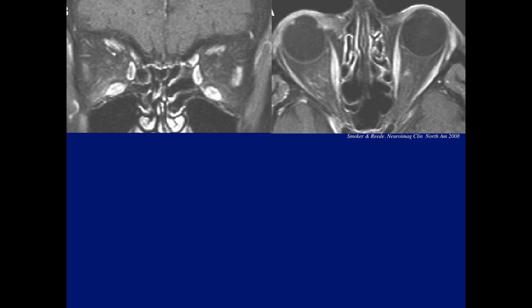And how about here? Last case I'm showing. Abnormalities on which side? All right, there's Gino, Nate, Ben, Matt. Everybody picked the right. There's atrophy here of the right lateral rectus.